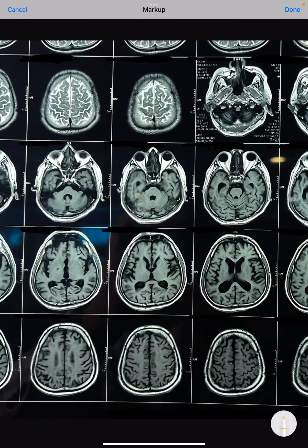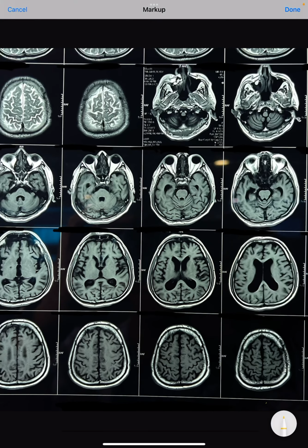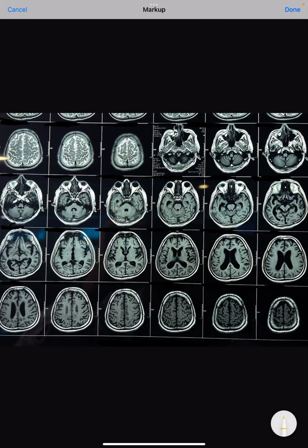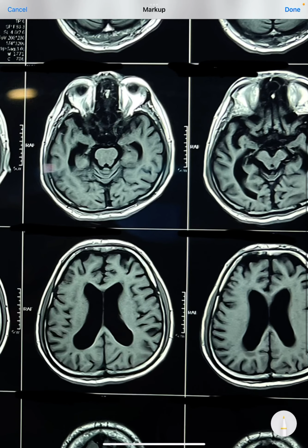So today I'm back with the video of anatomy of the brain structure in a normal MRI brain. Now, I chose this MRI because there is significant atrophy of the brain, so that we can see almost all the structures very clearly.